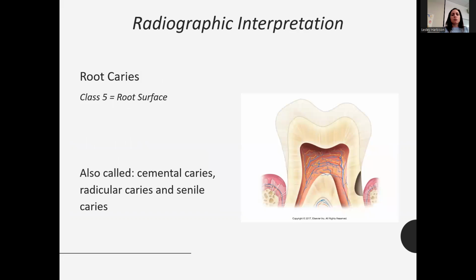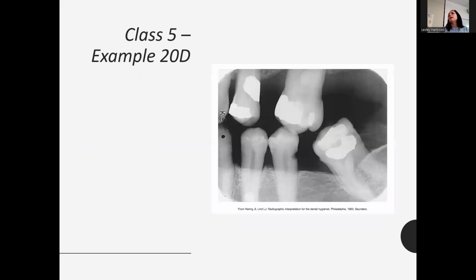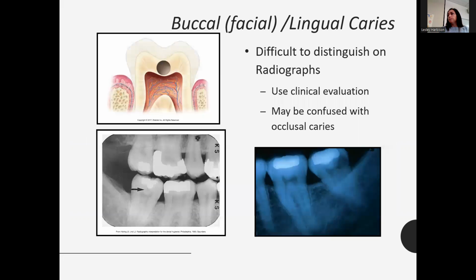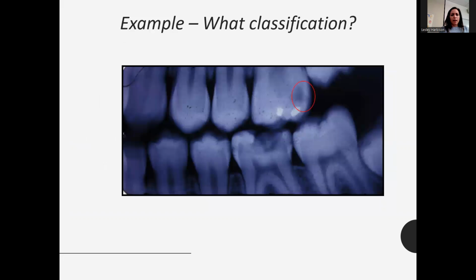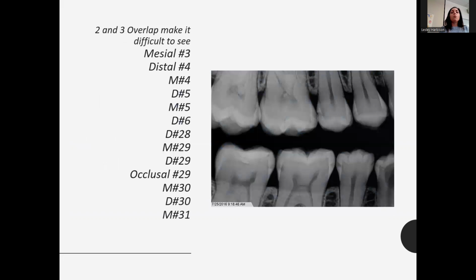So Monday's group has already done some caries interpretation, and you guys are seeming to do really good. So I'm imagining Wednesday is going to pick up just the same. I can't remember. How far did I get? Slide 19. Oh, that's right. This one with all the lots of decay in this one.